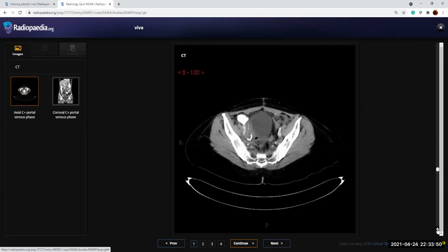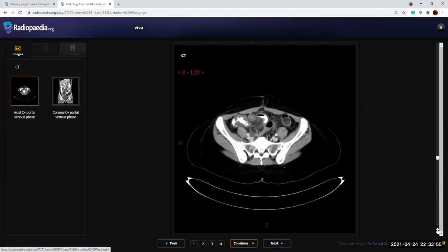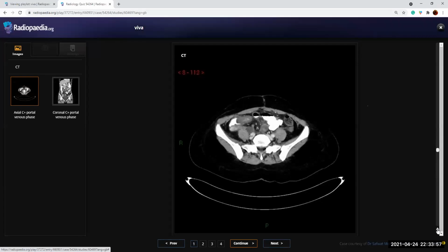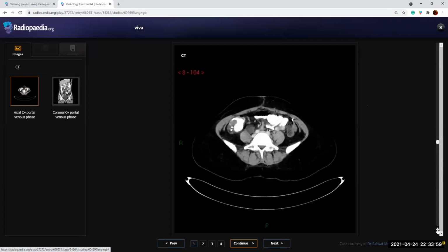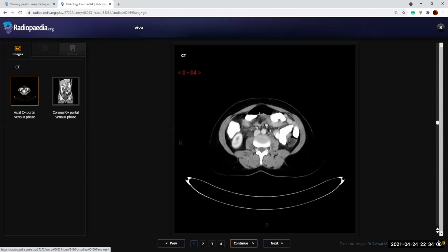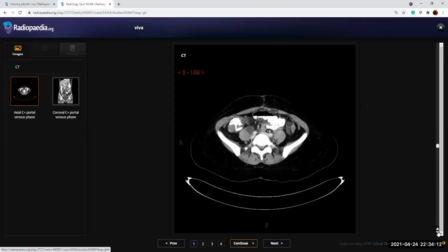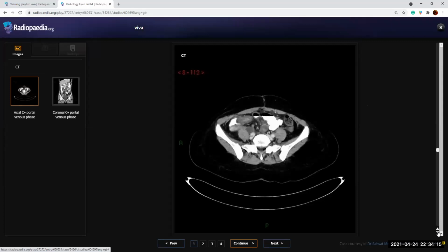And I can see that there is diffuse thickening of the... okay, so there is diffuse mural thickening of the small bowel loop seen in the right iliac fossa. Likely this represents a terminal ileum here. There is attenuated lumen and surrounding fat stranding and increased vascularity as well.